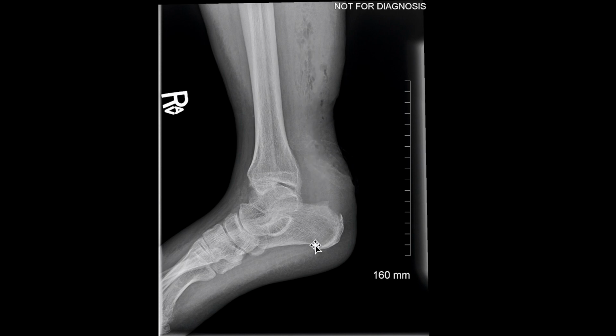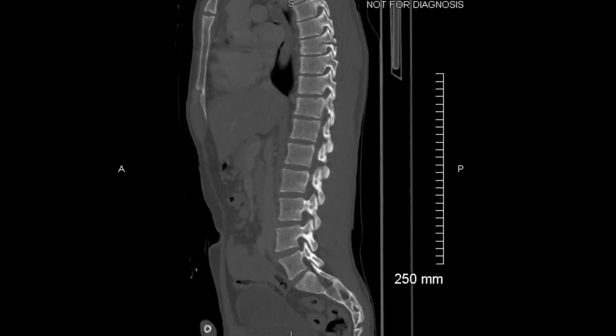The mortality of untreated necrotizing fasciitis is high. So in this situation, when you see anything like this, osseous destruction, air in the soft tissues, necrotizing fasciitis, call the clinician, call general surgery, do what's best for the patient. All right, last and final case, image 1 of 1.